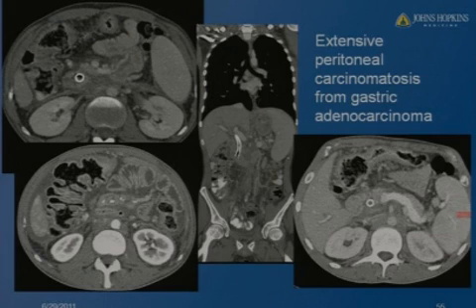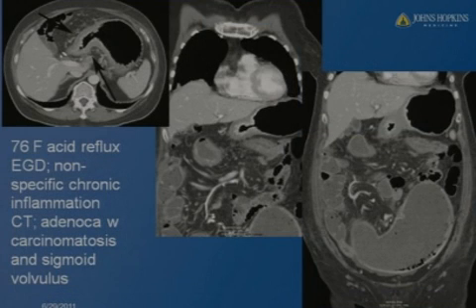You see the omental nodularity in this patient, and the coronal reformat images, if they project well, show the diffuse infiltration. The transverse colon is nice to look at because transverse mesocolonic nodular enhancement and infiltration is seen better. As opposed to this patient, where it's a little bit more difficult to see the peritoneal carcinomatosis.